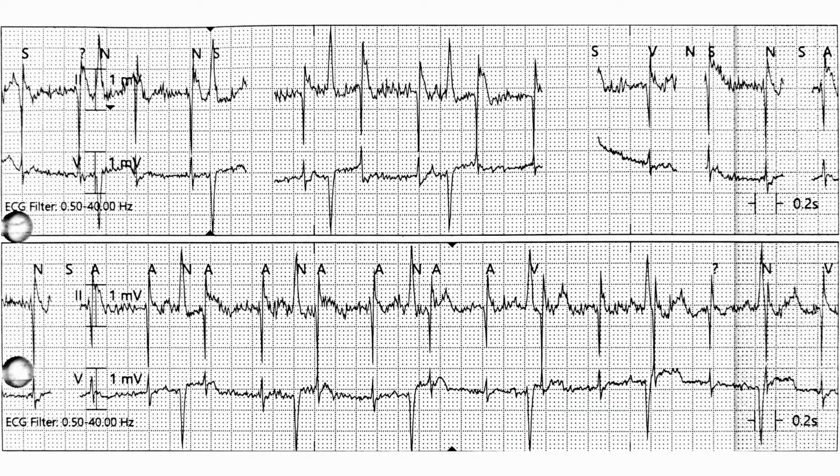So let's look at some other features. We know that the QRS complex has an ST segment and a T wave. And I see this low frequency wide signal here that follows each wide QRS complex. And this certainly looks like a T wave. This looks like a physiologic T wave. And there is something here that looks like a P wave before each wide QRS complex. So I think the wide ones are real and the narrow ones are artifact, because the narrow ones have nothing before them and not a whole lot after them either.